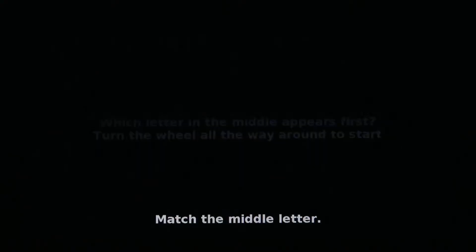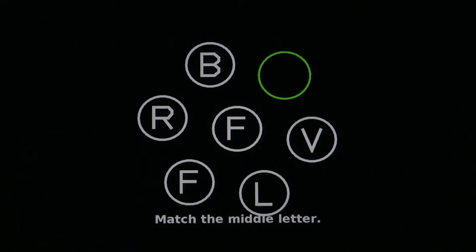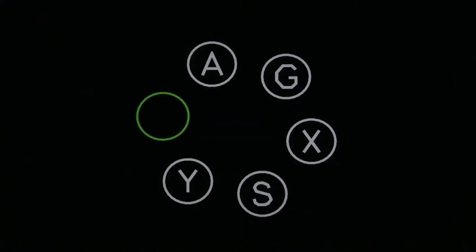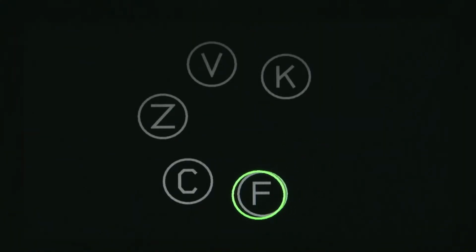To begin testing your letter memory, we are asking you to remember the first letter it shows in the center of the screen and then move your wheel to find it in the choices. Remember, we are asking you to select the first letter shown. Like in the previous part of the test, as you answer correctly, the specks are being removed.